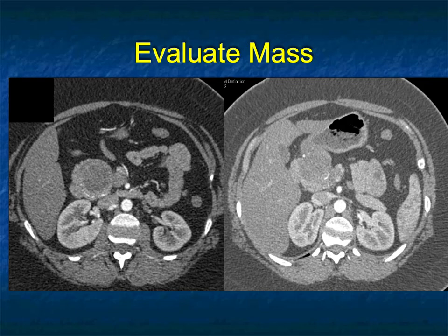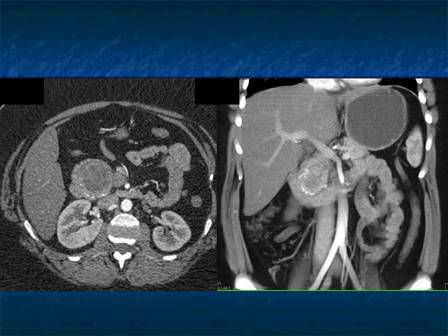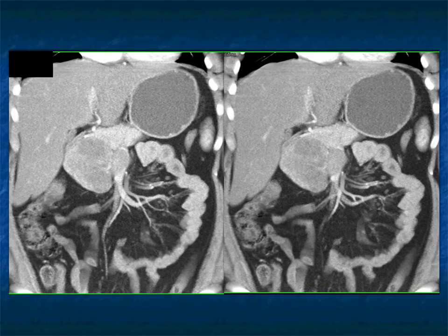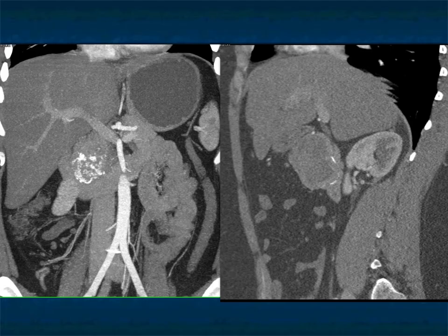What about this case? And this may be the last one. Cystic lesion head of pancreas, which has calcification. The patient was a 30-ish female. What could this be? Yes, you can think of serous adenoma. Neuroendocrine, less likely, is not very vascular, but there are calcifications. It's not adenocarcinoma with the calcifications, and there's no dilated pancreatic duct or common duct. Could it be an MCN, usually more cystic, not a great location? There's the MIP. It really shows the coarse calcification well.